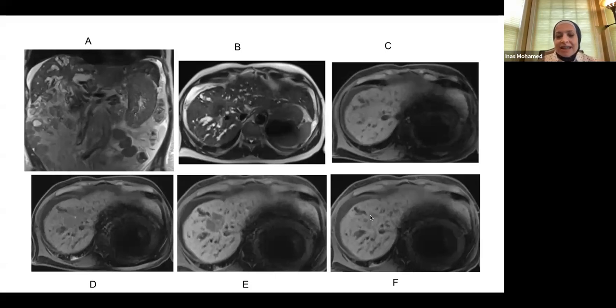Cholangiocarcinoma is really a fibrotic lesion. Sometimes it's just fibrous tissue, and it doesn't enhance except very, very late. I'm showing you the full-blown cholangiocarcinoma with invasion of the bile ducts, but I want you to keep intrahepatic cholangiocarcinoma in mind. It's very tricky.